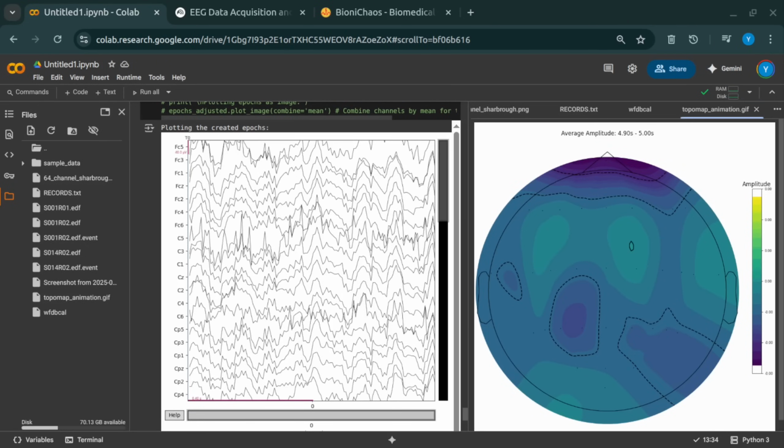Today, we're not just sifting through data, we're taking a thrilling plunge into arguably the most complex and fascinating data source of all, the human brain. Our mission: to explore how we can take those raw, squiggly brain signals and transform them into incredibly insightful and, honestly, surprisingly beautiful visual maps.